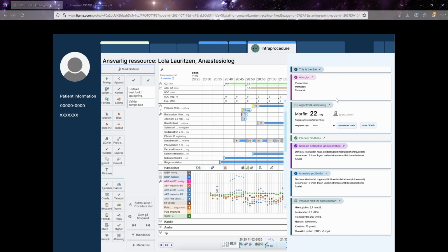This panel includes the ability to see the recommended dosage, the confidence on that dosage, the pre-operative recommendations, which we'll get to, as well as the ability to change opioid type. Now, the value here lies in that the nurse during an operation can see the recommended dosage without it impacting her workflow. And that's an important distinction to make, that this morphine dosage up here changes during the operation based on new continuous variable updates.